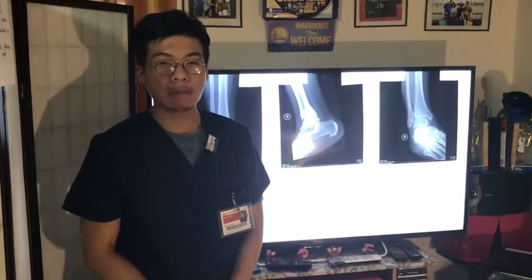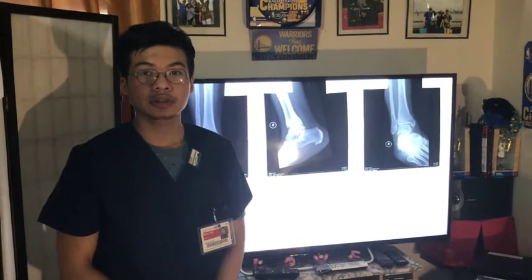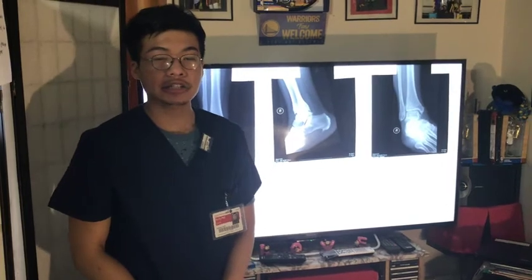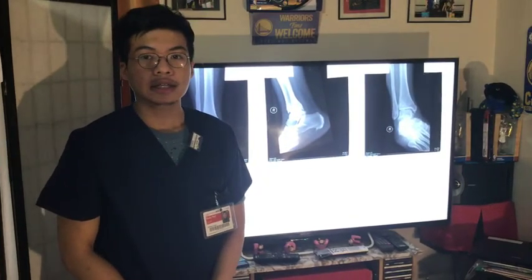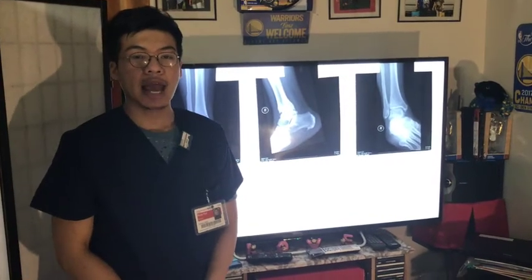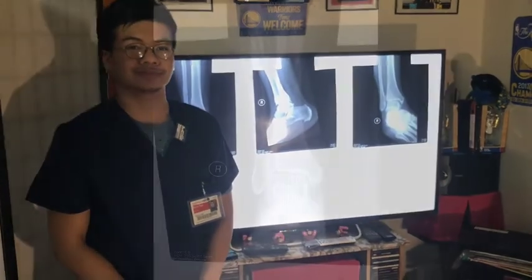Today I'm going to talk about calcaneal spur. The patient came in due to pain in the right ankle and installation of hardware. The patient is a 74 years old male, hypersthenic, and brought in a stretcher to the room.